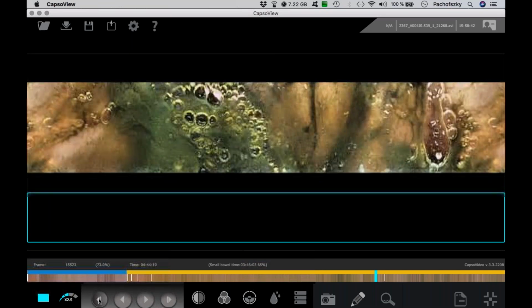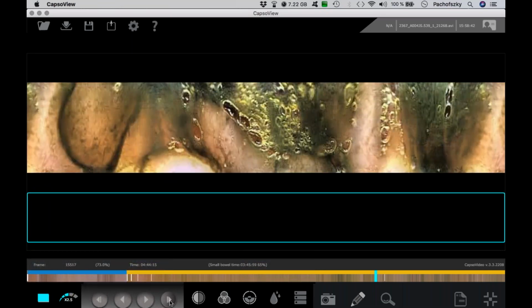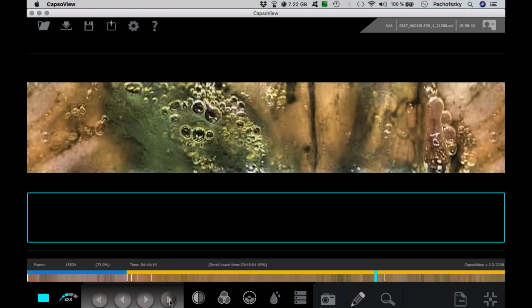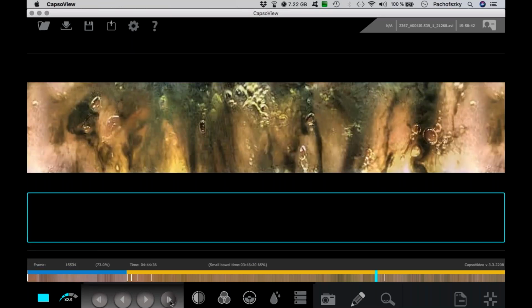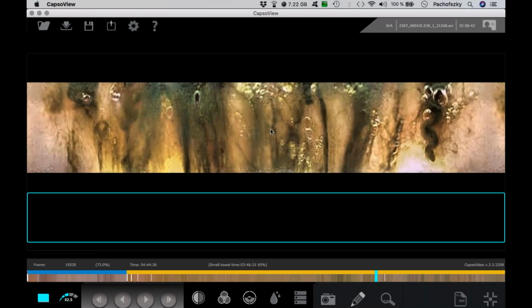And I think it's not so easy to say, but here we have also this flashlight, so it will be very narrow. And if you're going out here, just going back a little bit, here, the narrow thing, then a lot of stool here in this area, still the mucosa of the ileum. And then here in this area, I'm sure we have the mucosa of the cecum. So we set our last mark, the cecal mark.